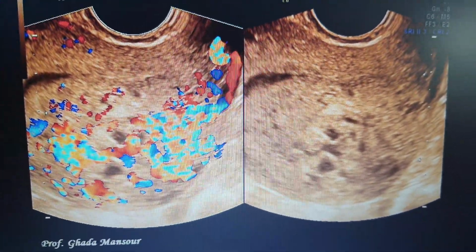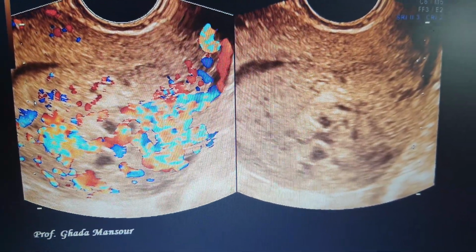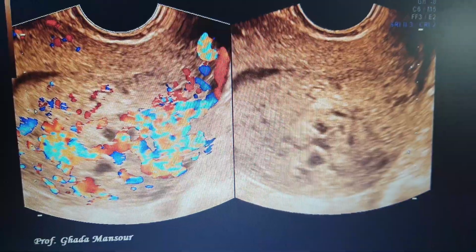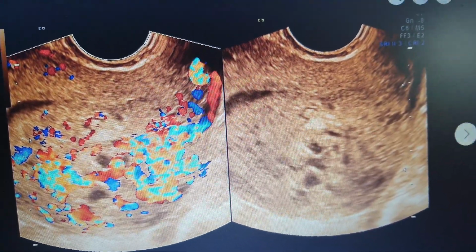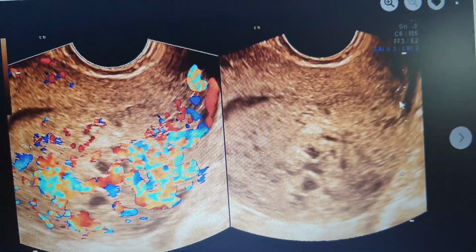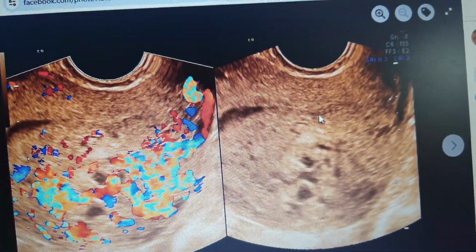As you see in this picture, we have two pictures. This is a double picture actually for the uterus before and after introduction of Doppler ultrasound. Of course, this is a transvaginal approach, and as you can see, this is a longitudinal diameter of the uterus, or a longitudinal section. This is the endometrial cavity and the endometrium here.